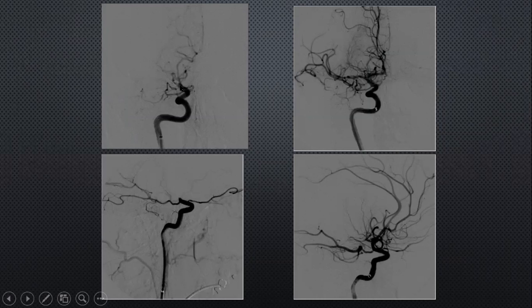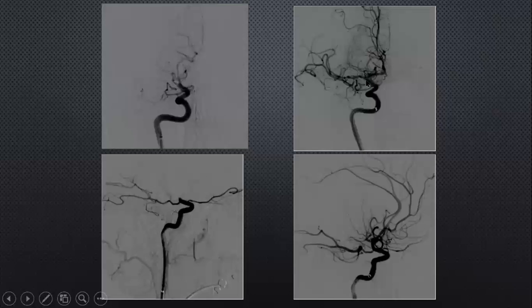And again here as well, what we are seeing is the PCOM, which is opacifying. So there is no opacification beyond the PCOM, and this is after recanalization. Just to show you the anatomy has regained itself, what it should look like after recanalization. So this is the normal appearance of the carotid T.